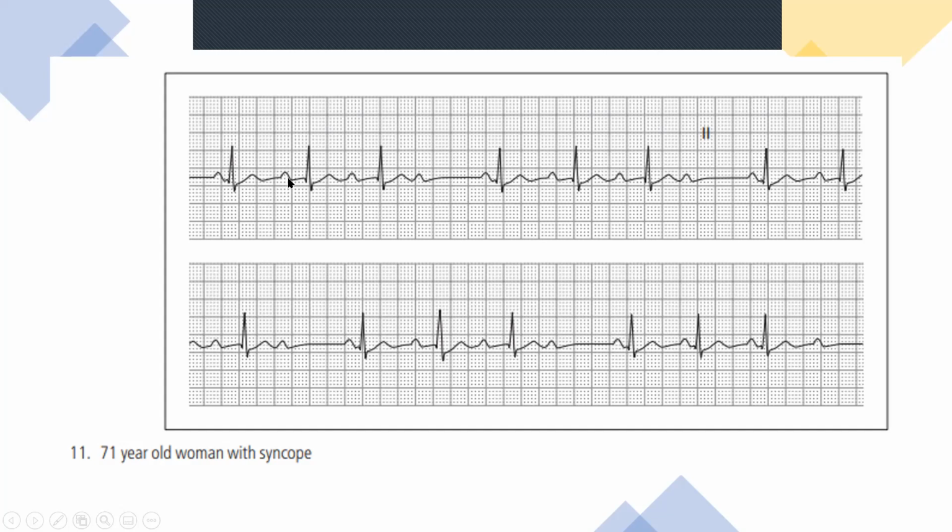So you can have, like, this is a 3-to-1 drop. You can sometimes have 4, even 5. Sometimes it is quite difficult to make it out once you start getting to the 2s. But this is the most common one, which is 3-to-1, where you see the elongation and eventually the drop. Elongation, and eventually the drop.